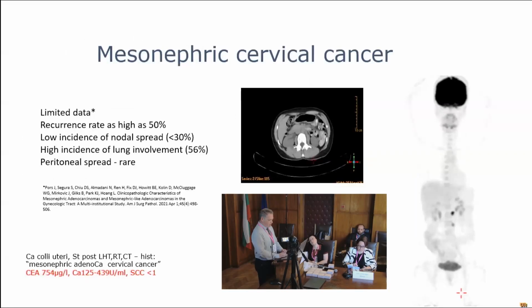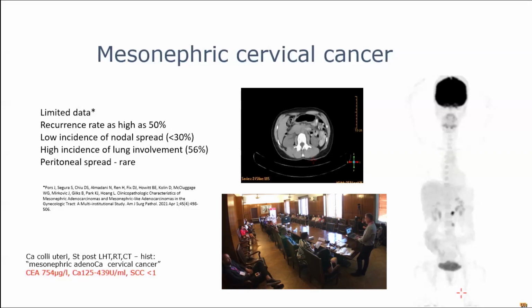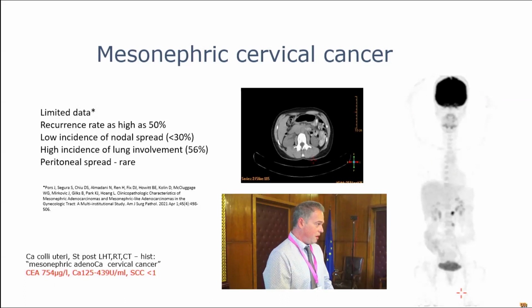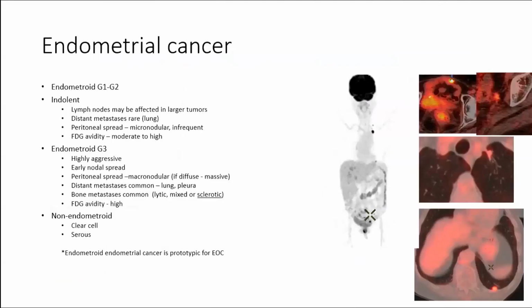This is a very rare one. I have only one case. I didn't find any specific pattern in the literature, just to confirm that mesonephric cervical cancer accumulates FDG well, and FDG can be used, especially in terms of elevated tumor markers.